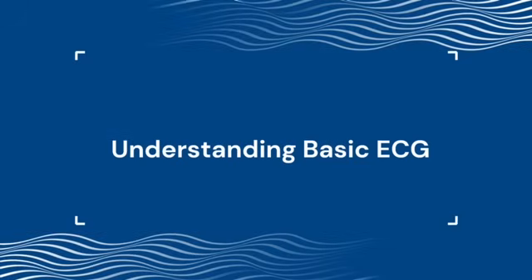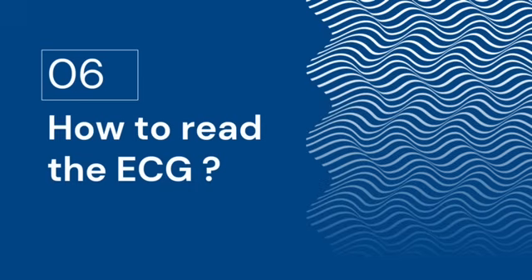Welcome again in Understanding Basic ECG. In this lecture, we will collect all the foundations and information we learned about the ECG waves, and how to calculate heart rate, regularity, and all things together to put them in a schematic presentation to know how we can read the ECG and how we can make a good comment on it.